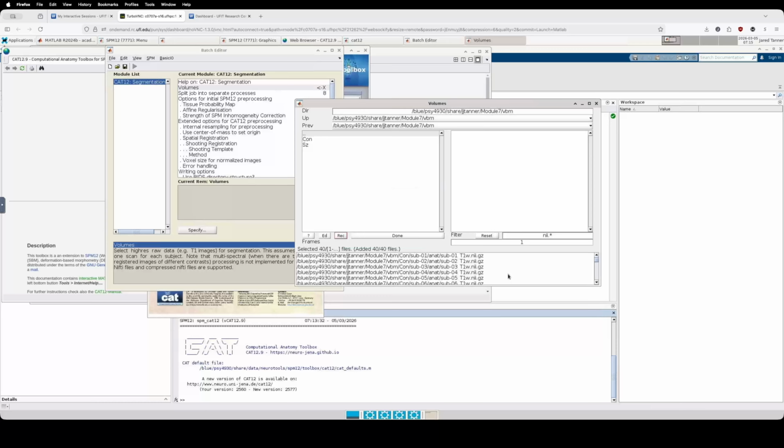And we want to make sure that when we're doing this type of analysis, the groups are grouped together. And this is why we have 2 separate directories, our controls and our patient group. I always like to have the control group come first alphabetically, so that way they are always the baseline reference group. You don't have to do that, but if you're setting this up for your own research or for a faculty member, a professor, this is an organized way to do it. And we can verify that all the controls are added first.